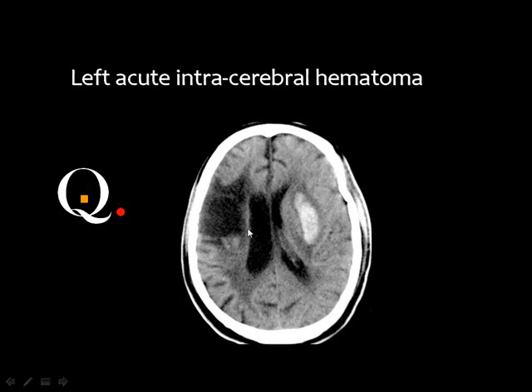It is dead brain tissue, and the dead brain tissue may be the sequelae of infarction, trauma, surgery, infection, or a previous hematoma. How can you know which one of these it is the sequelae of? You should have the previous films and you should have the clinical data.